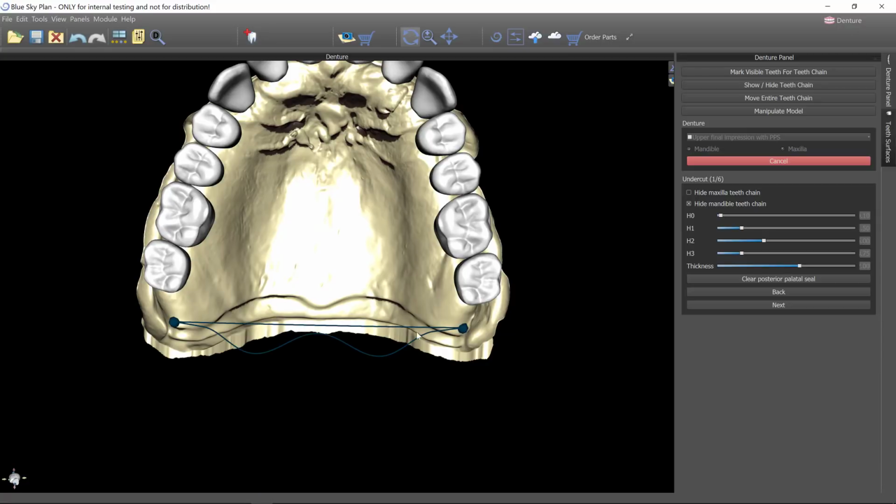But do you see the obvious problem with this? There's a little bug that's causing it to go in backwards, but I'll show you the functionalities that you're going to have with this.